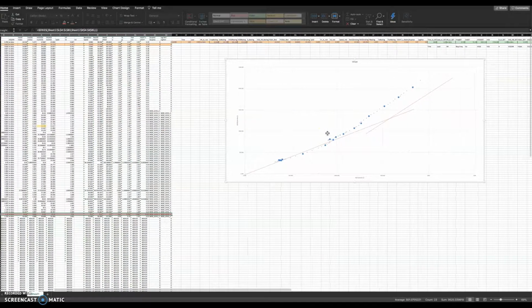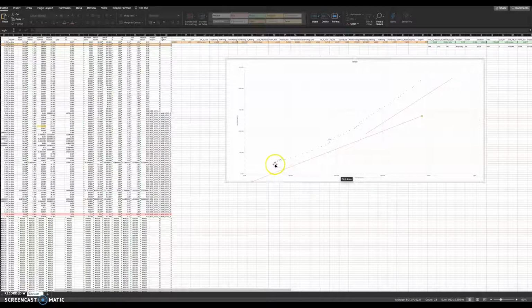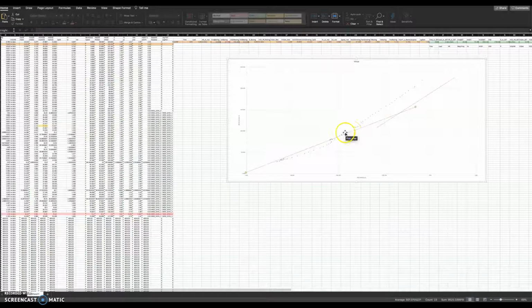What we're looking for is two distinct lines, and you can kind of see them here. Even if you just look at that, you can see this follows a linear pattern. There's a lower slope, and when we get to about here, there's an upper slope. There are two distinct slopes, what's called S1 and S2, and you're looking for this bit here, trying to get as many of these dots as possible. There is a funny pattern going on here, which I often see, but there's definitely a distinct kick that takes place up here. So if you drag this in there, try and identify that point.